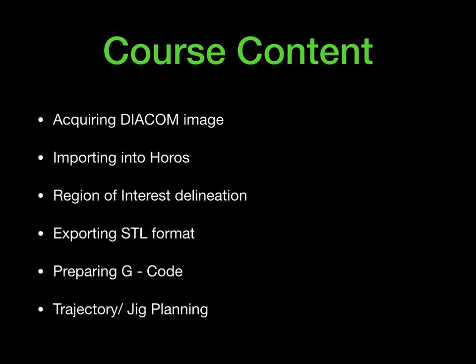So today we'll look at how to acquire DICOM images, import them into a software called HOROS. How do we define our region of interest and then export these files into STL formats? Basics about preparing G code, and then finally we'll touch upon the use of trajectories or jigs for executing complex surgeries.